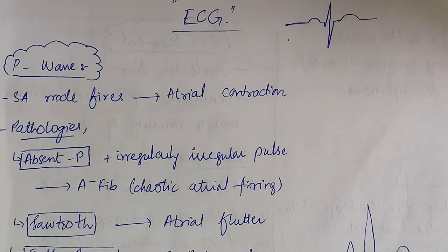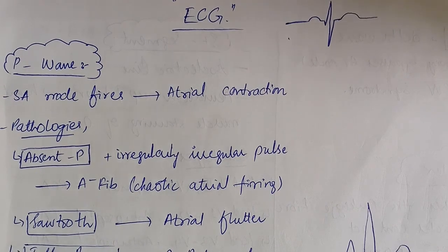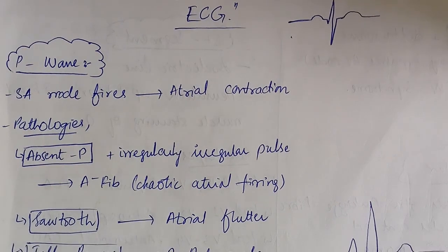That is ECG. There are certain diagnostic ECG strips that you have to learn. I will be sharing those and helping you understand the ECG and the classical ECG patterns that AMC loves to test. That is ST elevation MI, atrial fibrillation, ventricular tachycardia, SVT, atrial flutter, and heart blocks. These are some of the most important ECG strips that you have to know.